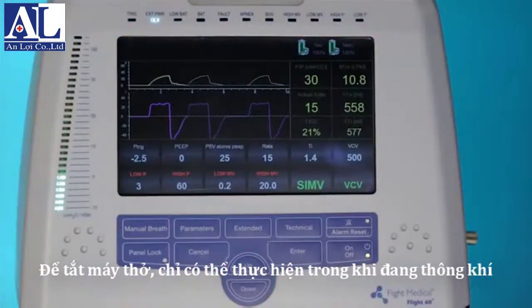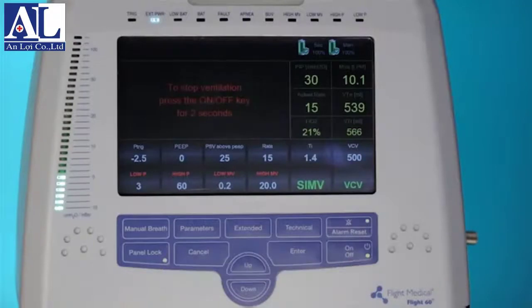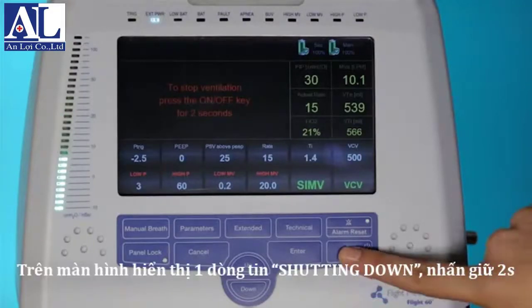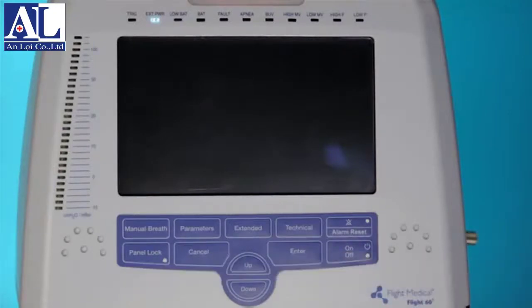Switching off the Flight 60 can only be done while ventilating. Press the On-Off button once. A message will appear and then press again for 2 seconds. When switched off, an alarm will sound. Press the Alarm Reset button.